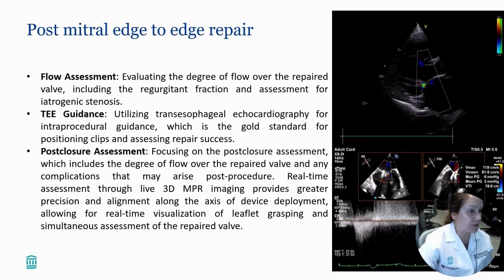Then, of course, an important step is how to assess the clip after the edge-to-edge repair. And this is the post-procedural assessment, where we use a very abbreviated but full protocol. Practically, we have the flow assessment to see if there is any leak around the clip. Of course, the mean gradient to assess that there is no significant stenosis. And of course, we assess the ASD to see if it's hemodynamically significant and will require closure before we finish the procedure.